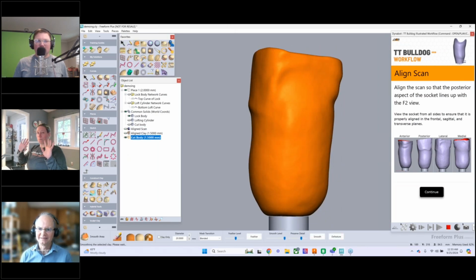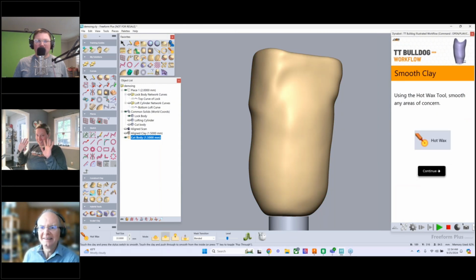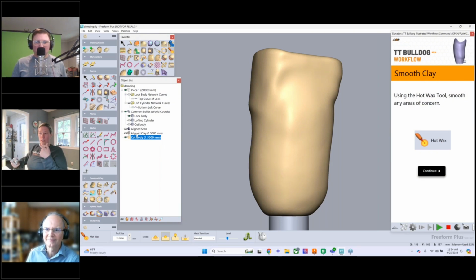Yeah, all in one. And now you're off and it's just running through the script. Yes. So all of those things were happening with me, my hands up here doing nothing. And it turned our mesh into clay. It renamed it so you know what it is.